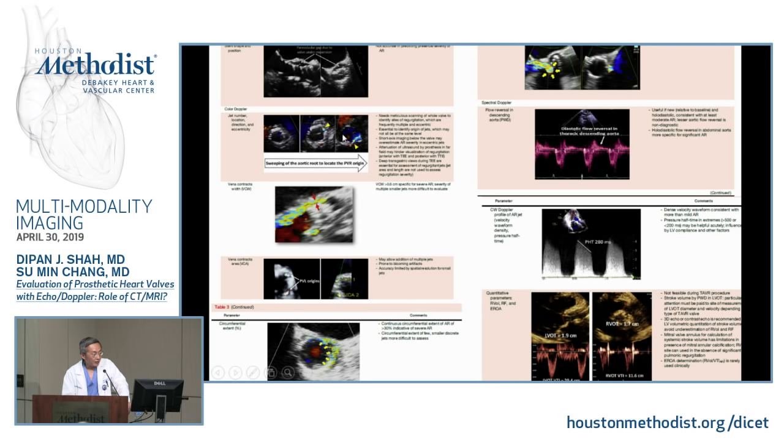So the key is to go through in a short axis view of the aortic valve, find out where the jet is, and ideally with 3D TEE, capture the jet and find out the vena contracta, and then the percentage of circumference involved by the jet. And obviously, if you have a proximal flow convergence, like shown here, like a pizza, this usually means it's a significant regurgitation. And flow reversal in the descending aorta is another sign.